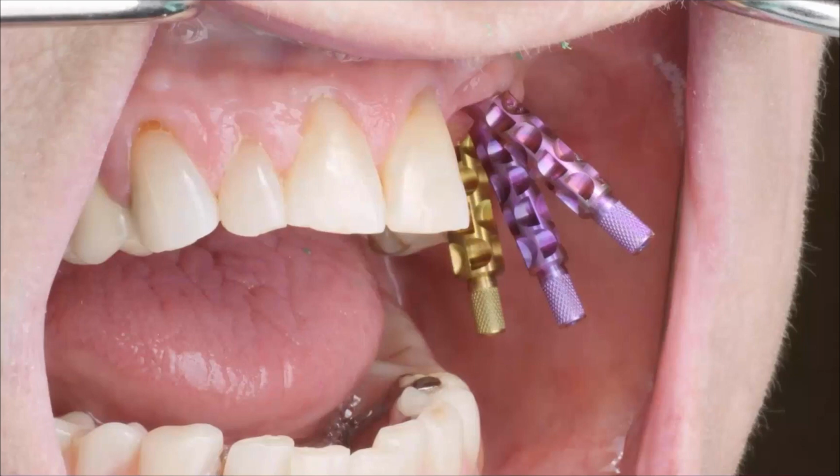So how does this happen? It's two reasons. Reason number one is poor execution, right? From a technical perspective of implant placement, it's poor execution, whether you intended the implant to be there or not. The other part of the equation, though, is poor planning. In other words, even if you have really good hands and you're really good at placing freehand implants, how did you come up with the idea of where that implant position should be? So when I see something like this, I think of two failures. One is obviously the surgical placement, but number two is how did you develop an idea of where the implant should go in the first place?